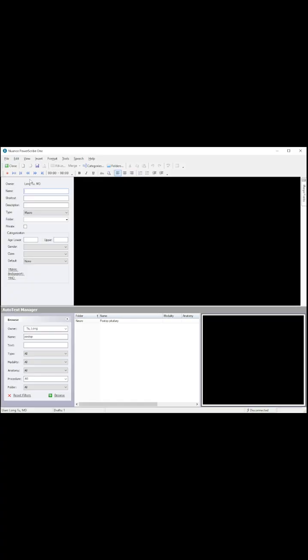So sometimes what I'll do is I will literally open it. If I need to use it, I'll open it while I'm doing something else just to wait for it. It takes like, I don't know, a minute maybe to load. I don't know exactly why that is. It's gotten worse over time. Hopefully that gets corrected. We've been working on it, but it hasn't been corrected yet.